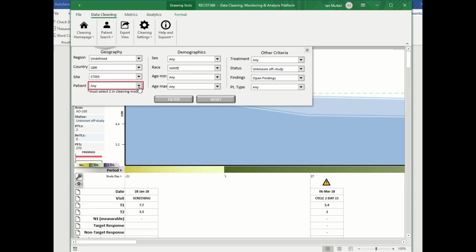If you are watching this video, it is assumed you have already used the free online facility and reviewed output. If not, please see video description or comments for details. The online version is a free version of the same tool, but it lacks the full features because it is a simple XLSX Excel file.